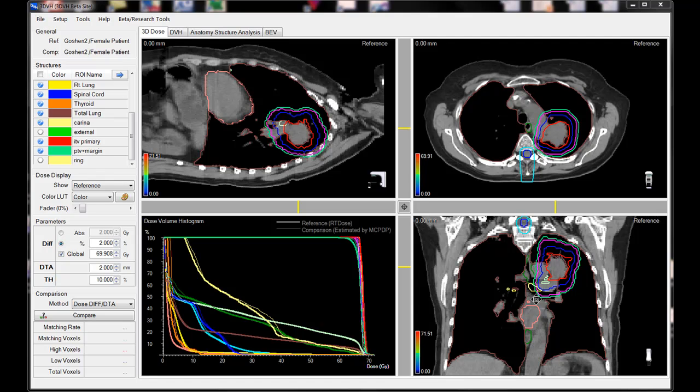I'm going to give a quick overview of 3DVH and the powerful tools you can use to do your analysis of dose QA. I first want to remind you that the way we conventionally do dose QA now is based on passing rates of dose in a phantom, and I'll talk a little bit more about that later, but wouldn't it be nice if we actually knew the impact of any imperfections in dose that we could or couldn't detect with conventional methods? So what you're looking at now is the 3DVH analysis interface.